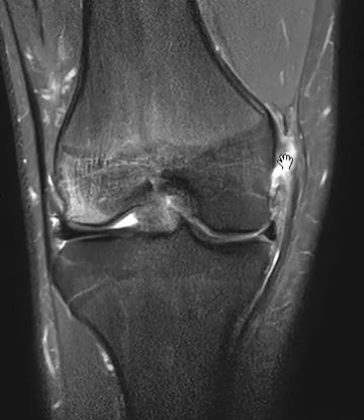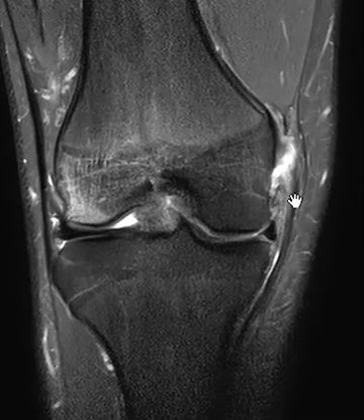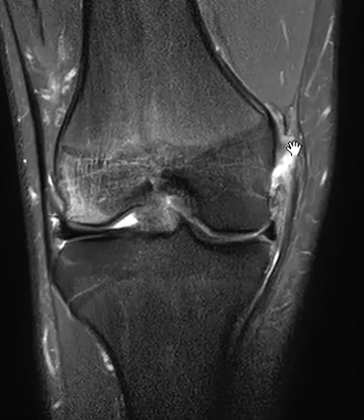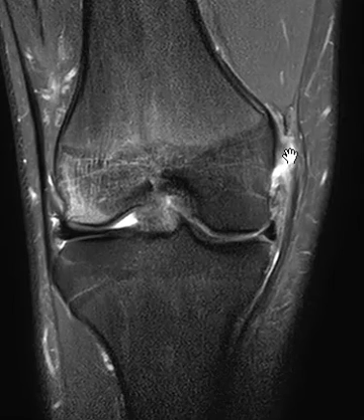There is a bright band of signal here. This is fluid, and it's going between the femur and the medial collateral ligament. So this is the medial collateral ligament on the medial joint line. It's completely torn, separated here with a little bit of fluid. This is a grade 3 injury where the MCL is just non-functional because it's torn and uplifted.